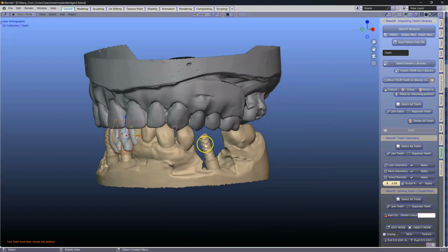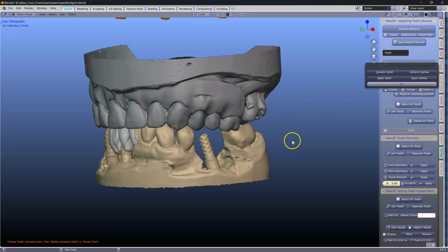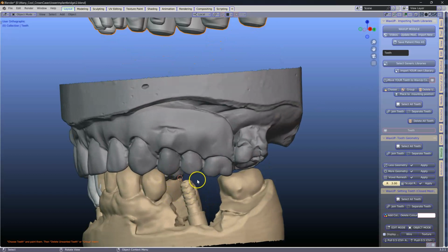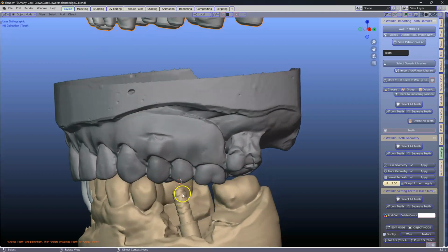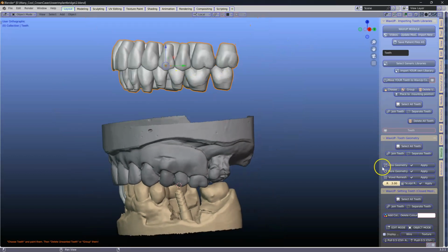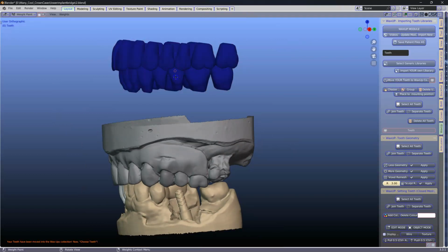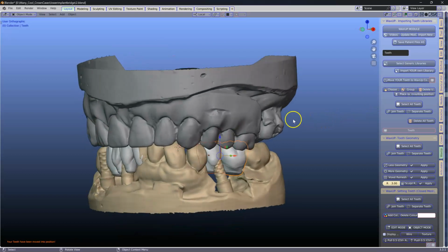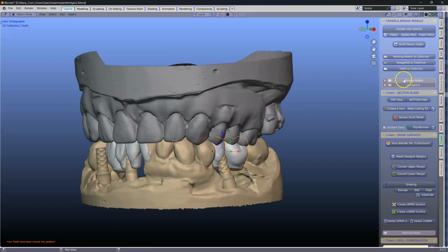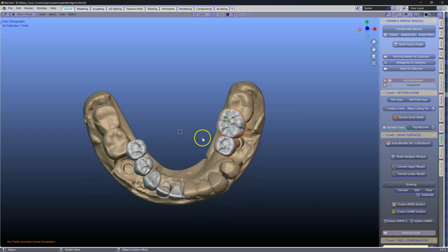We forgot one tooth. We forgot the molar over here. So let's just bring it in again and choose a molar. Actually, we could maybe even fit two premolars in there, or maybe a premolar. The spacing is really tricky. Let's take a molar and a premolar. All right. Okay, choose this one and this one. Delete and place to mounting position. All right. Okay, I'm going to go to the crown module and just hide the antagonist so that I can see what I'm doing.